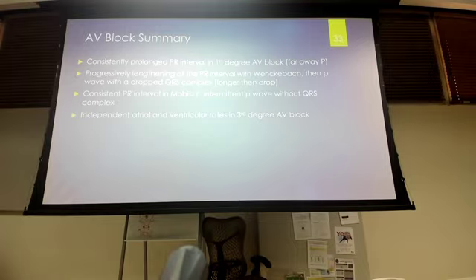And then third degree AV block, very low heart rate in our bottom rhythm strip. We're going to see our QRS complexes. Once you put your paper on those QRS, the first one, and then go to your next R, move it over to your next R with a QRS complex. Move it over to your next. They're going to line up. They're going to line up perfectly.